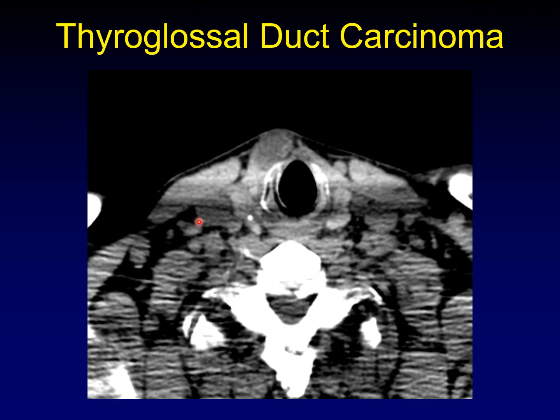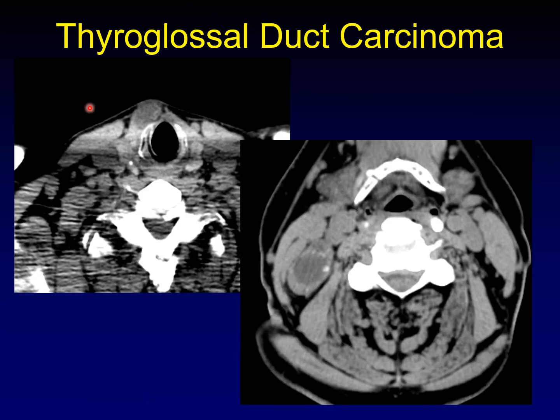Here's another cystic mass in the expected location of the lymph node. That's a metastasis of this carcinoma. This is that same picture, and this is an image that better shows the node in question or one of its friends, and you can see the suggestive calcifications in a cystic, partially cystic lymph node.